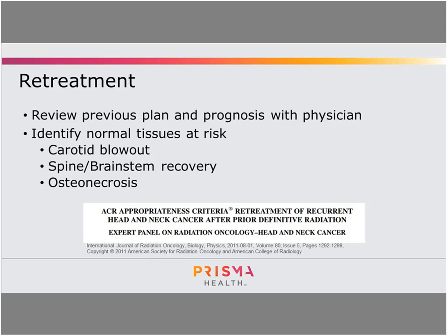We don't have a lot of great information on what happens in adults with this, but MD Anderson has published about monkeys that they reirradiated, where after about 3 years they showed full recovery. Around 2 years, I think it was 80-ish%. St. Jude has published on reirradiating pediatric patients, showing that brainstems recover as well. So these things do recover, but we don't have great data on what happens in adults when we retreat a year or two later.